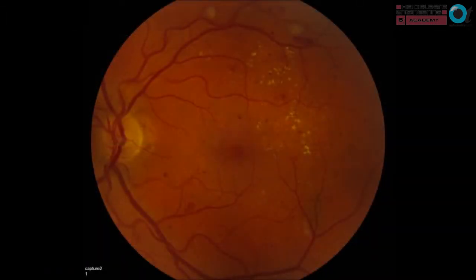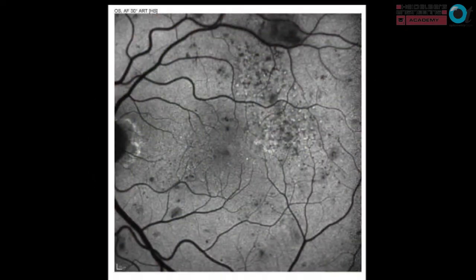So we instituted retinal therapy, some gentle laser, and you can hardly see the burns on that color fundus photograph, but you can see the number of exudates have reduced. But as soon as you use something called blue laser autofluorescence, which shows up the retinal pigment epithelium better, you can see the distribution of burns that I applied to that patient.